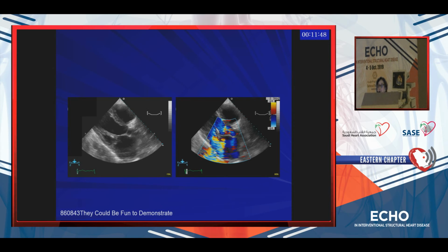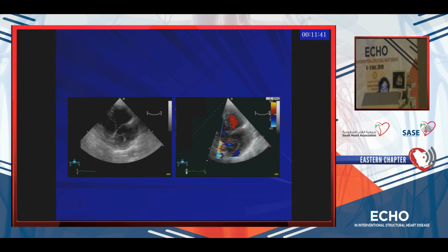You've already seen 2 cases from 2 speakers about what I'm going to show you, but this is the inflow of the right ventricle, and you can see this cystic structure in the middle. You have to admit it's the nicest of the 3. And don't start thinking of hydatid cyst and all those funny things.